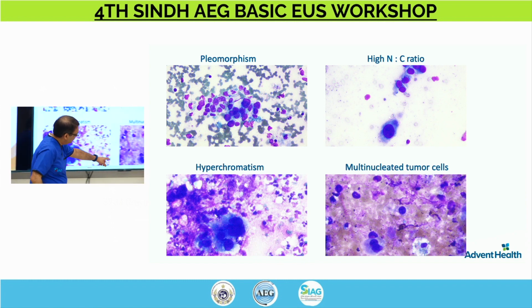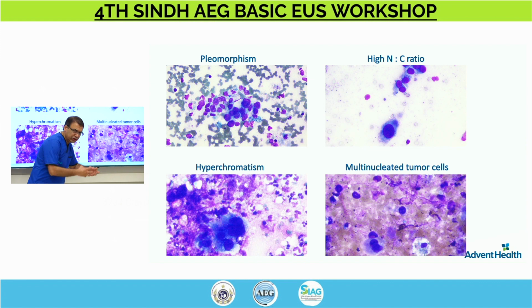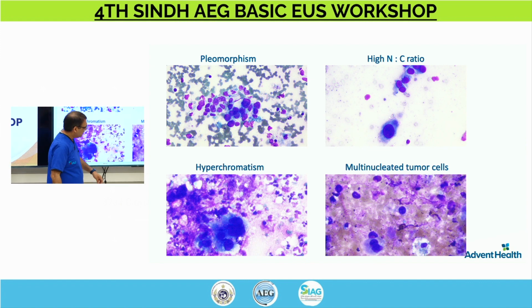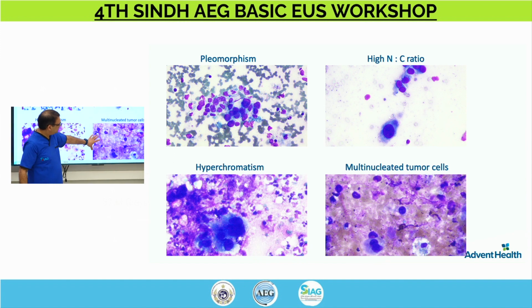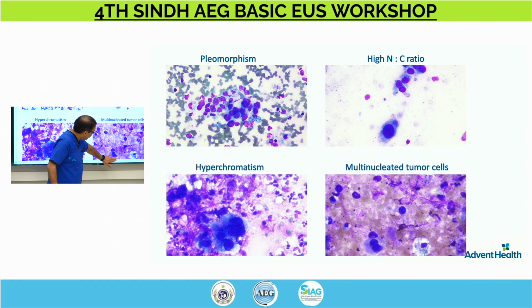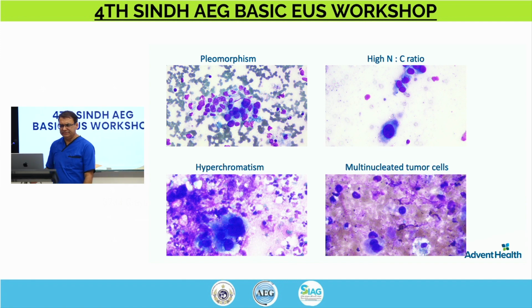You see some cytoplasm around it, so it's not one cell overlapping another. Okay, this one is such a cell. And also, likely not overlapping, because look at the chromatin here, and different sizes, they're big compared to the RBCs. So this is called a giant cell.